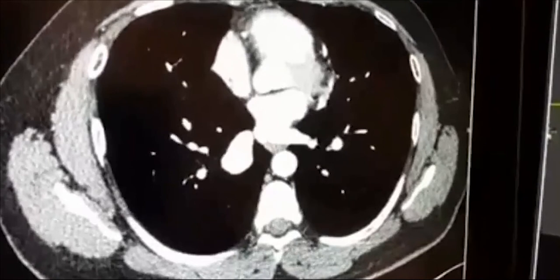Now here, look carefully. The structures are all very important. Here you can see the ascending aorta just opening into the infundibulum and inside into the left ventricle. So still the left ventricle is not much visible at this level, but we can make a judgment that it is about to open into the left ventricle. So this is again the right ventricle, this is the right atrium, this is the left atrium, and it's receiving its pulmonary branches from both sides, and this is the descending aorta. And this small part over here is the azygos vein. So let us scroll down and check.